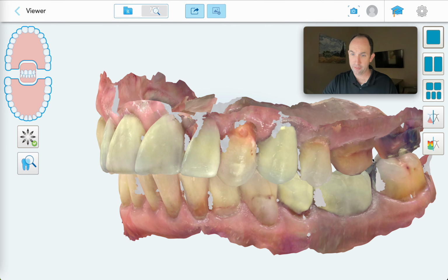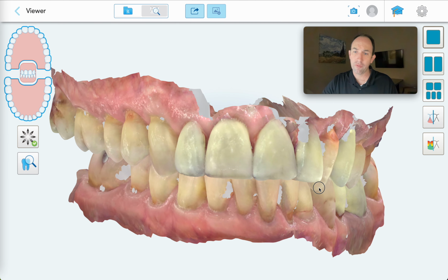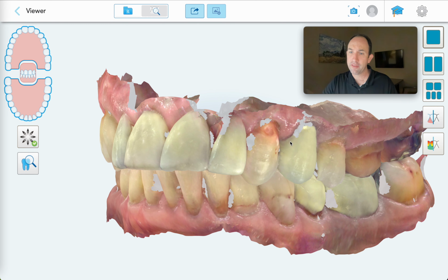These two, as I said, were where we started. And so we'll get to a point at some point where we'll work through the lower right and see what we can do to get things moving for her.